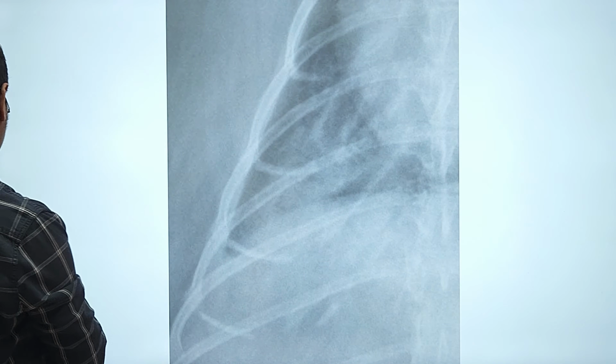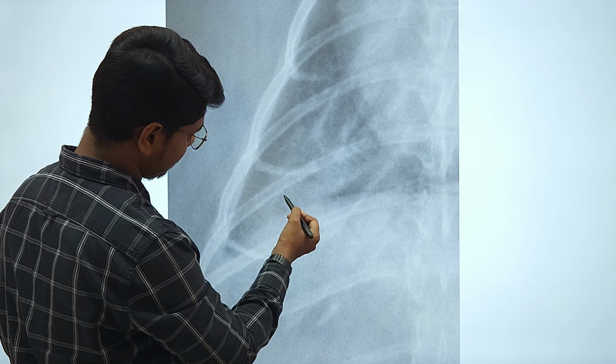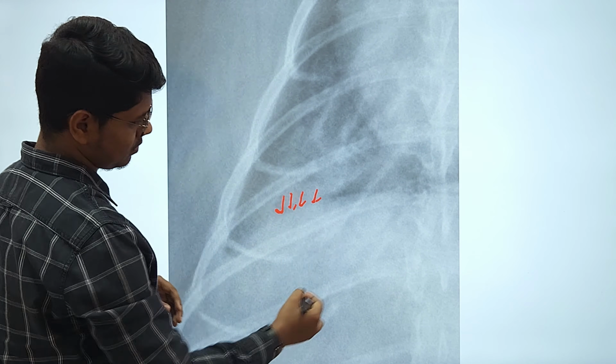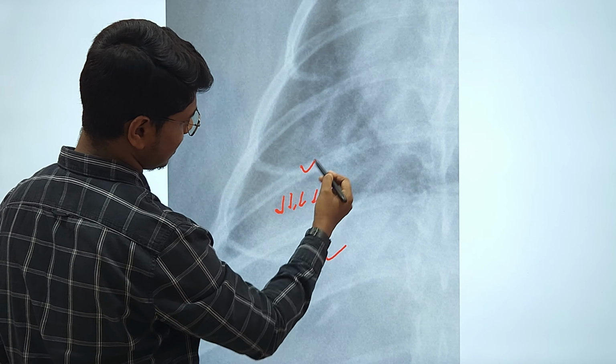This is another radiograph where the left caudal lung lobe has been affected. Can you see the thoracic outline of the diaphragm is lost, so the opacity of this particular diaphragm is the same as that of this opacity.